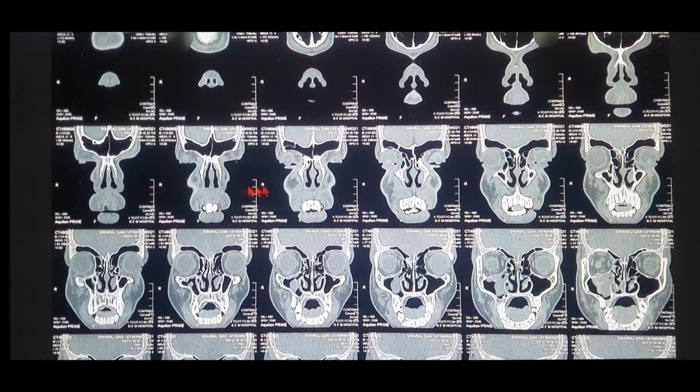The septum appears to be almost in the midline with a septal bulge in between. I still do not see any nasal mass or deviation of any kind, except that I start seeing some opacification over here in the maxillary sinus, which could be because of secondary obstructive sinusitis.